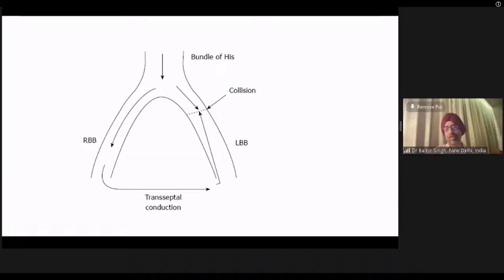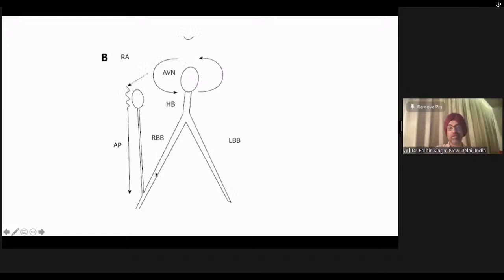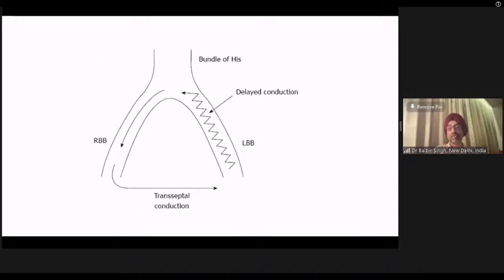So in this atriofascicular pathway, you have something like an AV node. This inserts into the distal right bundle, then goes back through the AV node and comes back through the accessory pathway. So this is basically an antidromic tachycardia with pre-excitation through the atriofascicular pathway. And it could be an AVNRT going on, which is causing return cycle from the atriofascicular pathway. In this patient, we induced AVNRT after taking care of the accessory pathway.